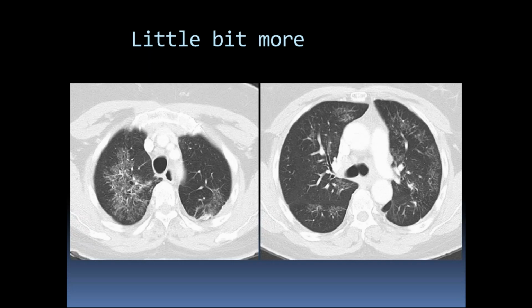So this one is a little bit interesting because this is more of a ground glass appearance, and it's not nodular. So it's not the typical ground glass nodules that I showed you in a couple of cases. This is actually larger ground glass opacities, but it's not your typical appearance that you can just wonder about or blow off as nonspecific. This actually seems to have a little bit of structure to it.